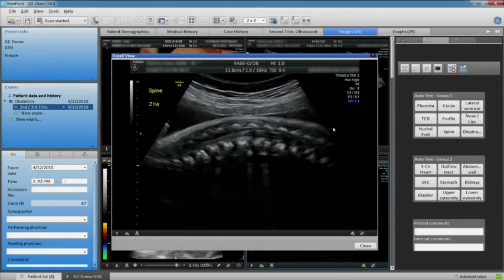You can also add comments associated with an image. Any comments added to these fields can be searched for in the VP Explorer. Printed comments appear beneath an image in the report, whereas internal comments are seen only within Viewpoint.